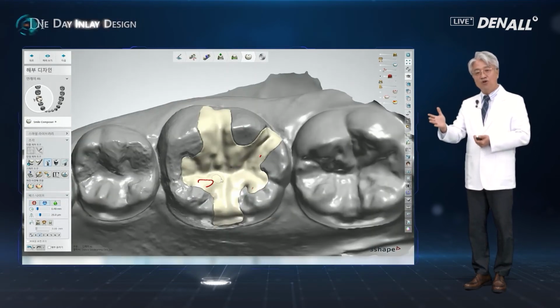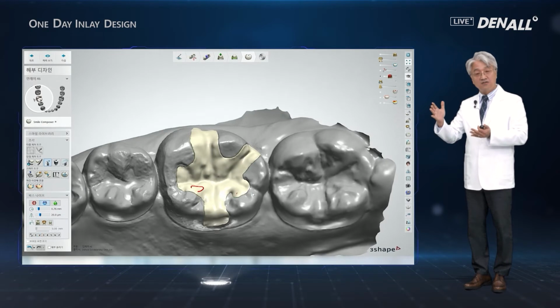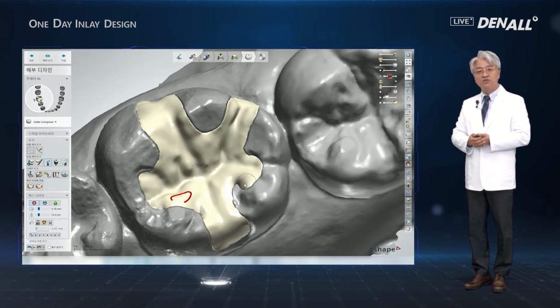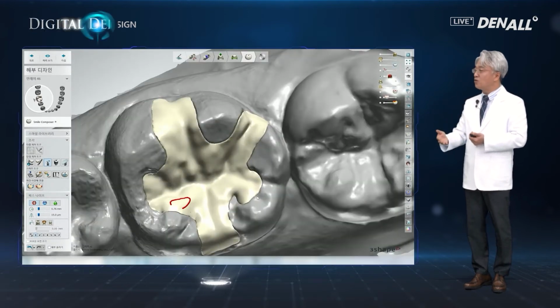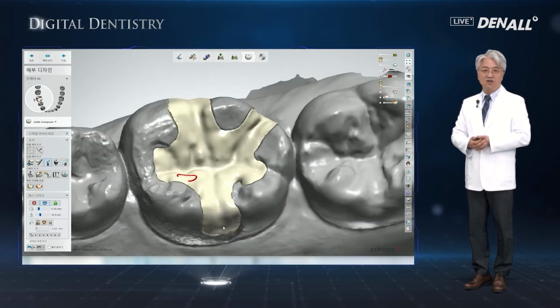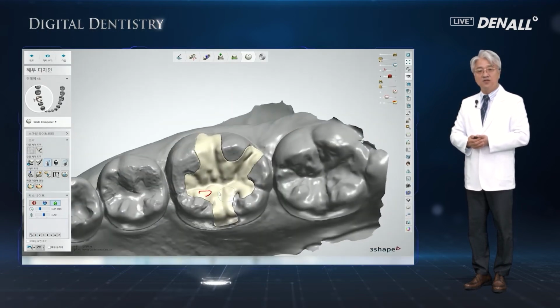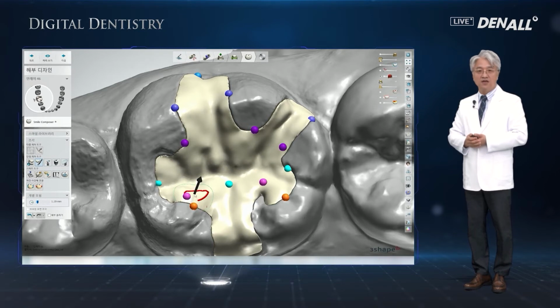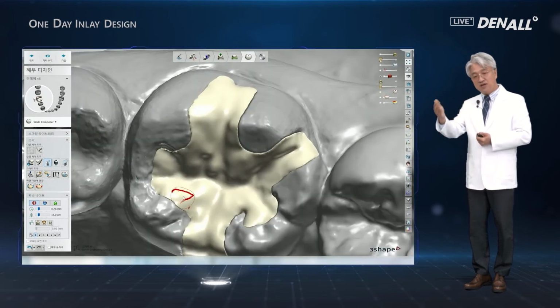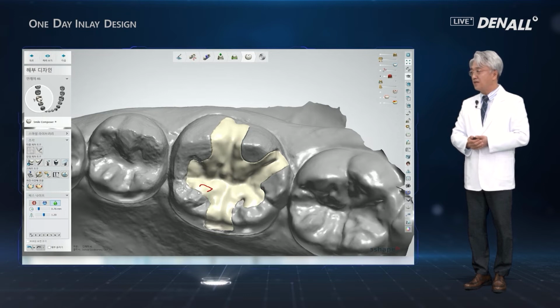The prosthesis can be set very stably, and using this inlay, the patients will find it comfortable. Because of all this, problems can be prevented beforehand. So this means that a high quality prosthesis will be offered to the patient and to the dentist. Because of that, in many aspects, this is a very useful and helpful system.